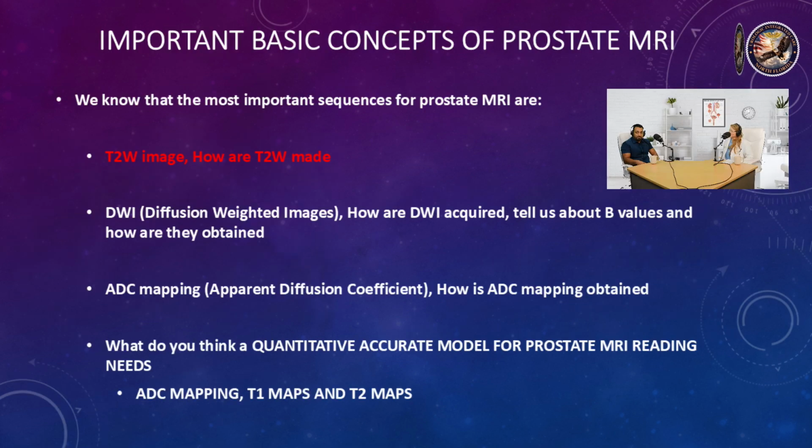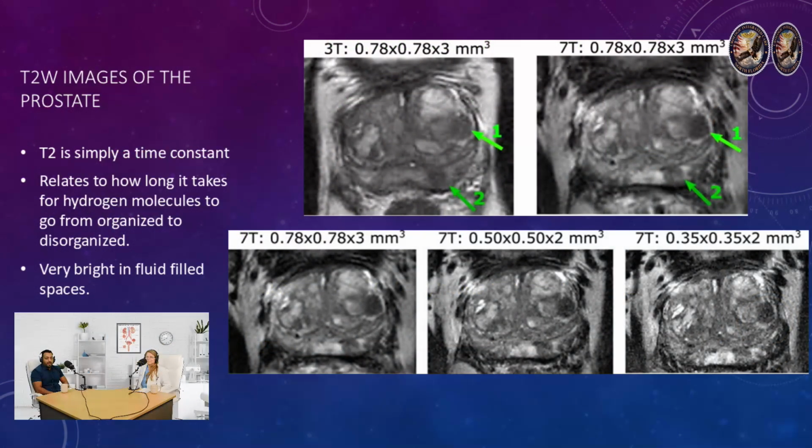But yeah, next slide. I'll start off with T2-weighted images, and I think the next slide actually has some images here. Perfect. So these are examples of T2-weighted images. Generally, I've been asked this: T2-weighted, T1-weighted, proton density, DWI. What do all these things mean?